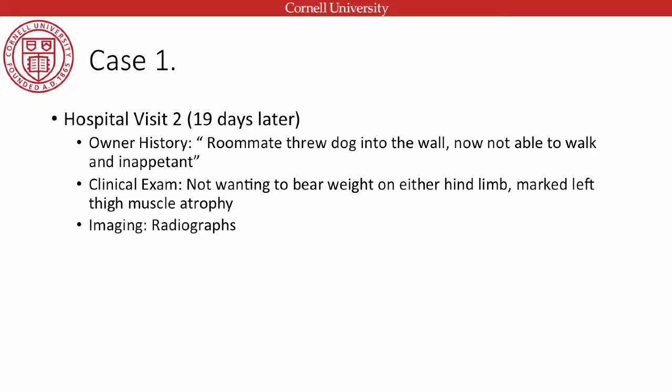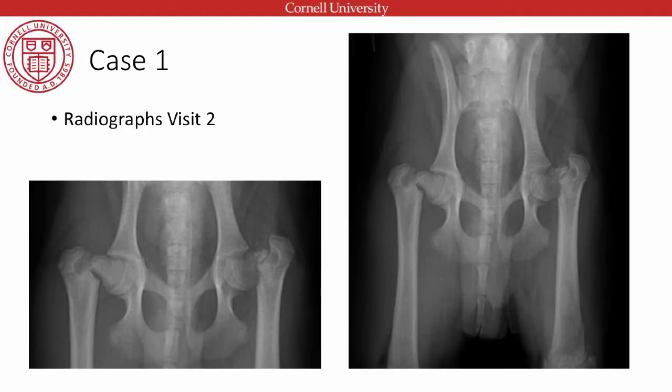Okay. So what we have here is a radiographic examination review of the pelvis, femurs. This is a nice straight femoral view. We really like these views, and here we can see on both sides that we have femoral neck fractures in this case. This is the more acute side, where we've got quite sharp edges going on here. And this is the more chronic side, where we've got some proliferative new bone forming at this stage. And this would be probably appropriate for 19 days post-injury, which is what happened in the previous pots and pans incident. And then this is the thrown against the wall injury here.